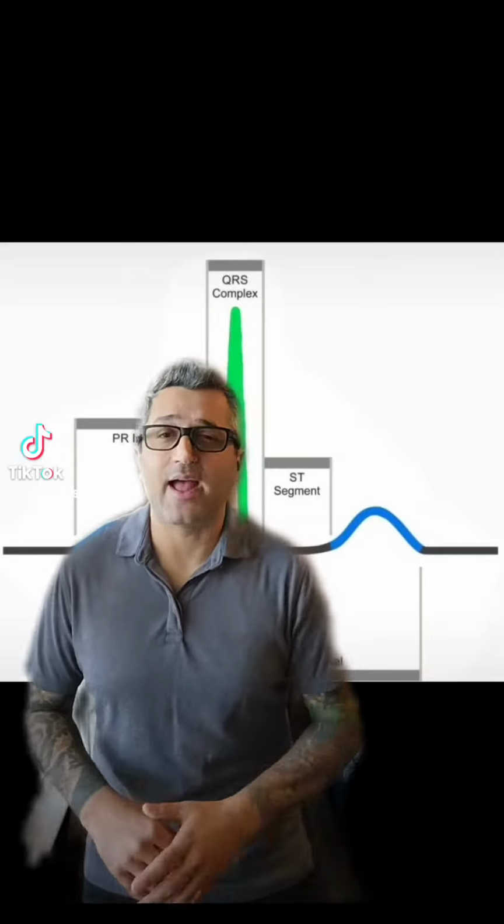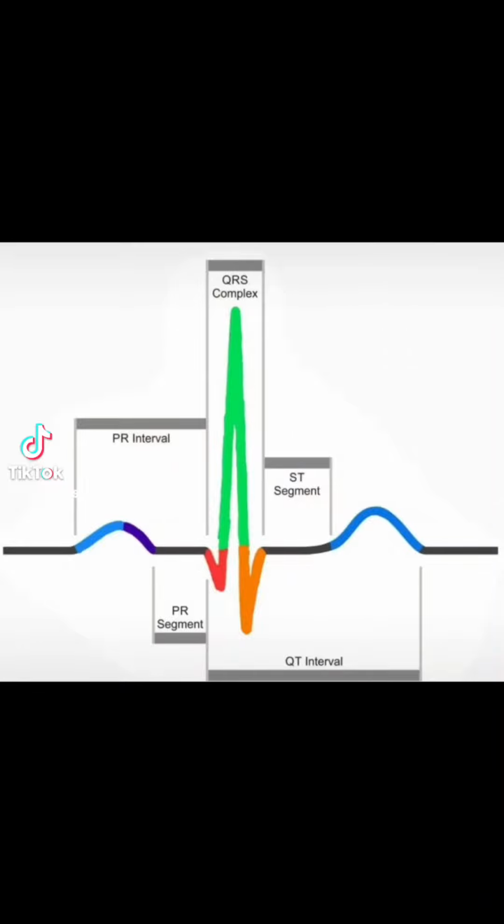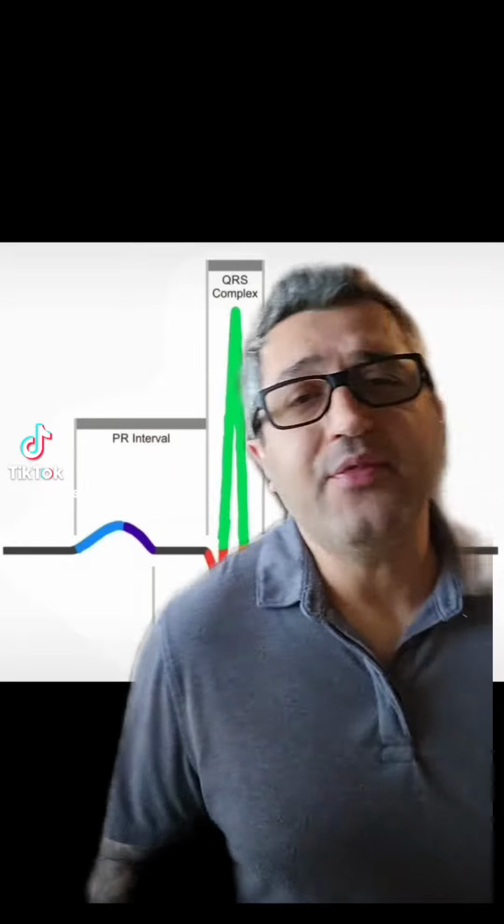If you've ever had any sorts of EKG training in the past, I'm sure you've seen this picture or a variation of it in a textbook before. And though we know what these bumps and squiggles represent, how well do we actually understand why they look the way they do? Let's talk about it.